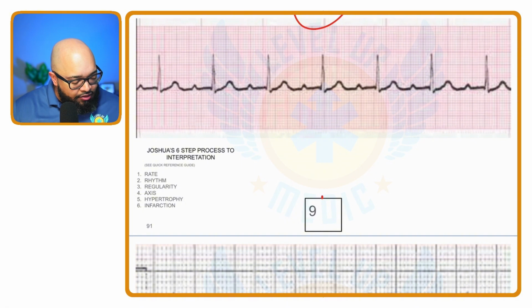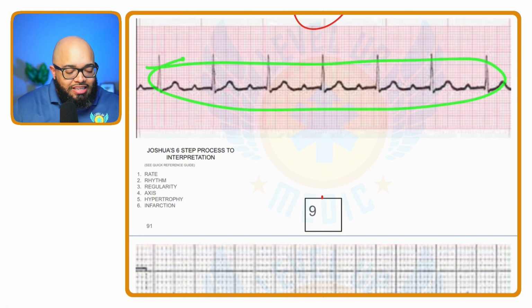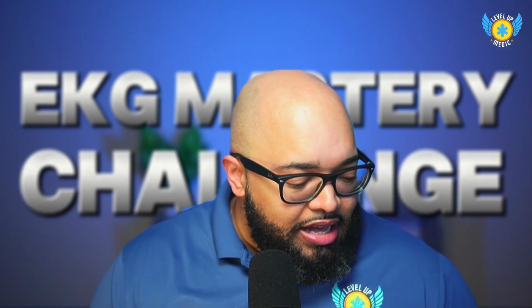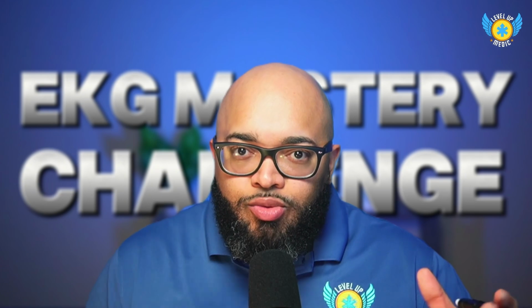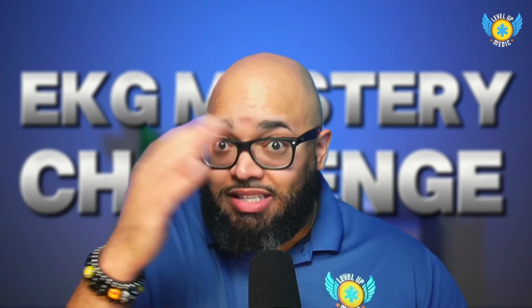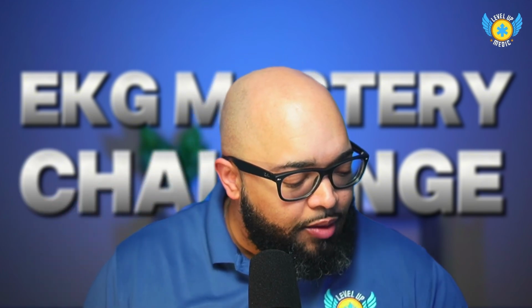Now, I'm going to jump ahead for a minute. When I look left to right, this is very regular, but let's go back to the rhythm part. Everything has to be normal for it to be a sinus rhythm. Okay, the rate here falls within the normal range. It was about 75. It's between 60 and 100. That falls within the normal range, but let's pay attention here.